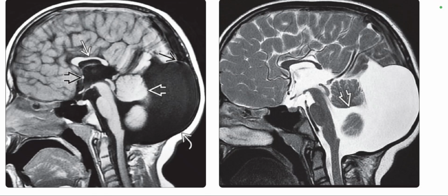So this is the classic case of Dandy-Walker spectrum. Midline analysis using the sagittal T1 weighted MRI shows the classic findings of this case, Dandy-Walker with a large posterior fossa cyst, high torcula, and a small upwardly rotated vermis. There is also a significant commissural anomaly with only a small corpus callosum remnant present.